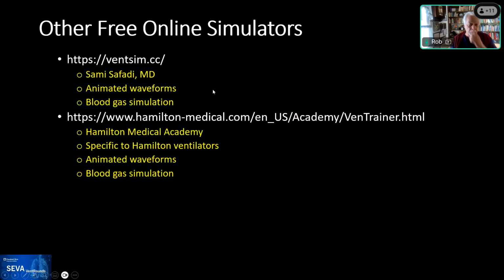I don't know to what extent these blood gases have been validated, but for our purposes, they're quite good enough. I will also point out that Hamilton has a medical college online that's free to anybody. All you have to do is go there and set it up. You can see a simulation of virtually every ventilator that they make.